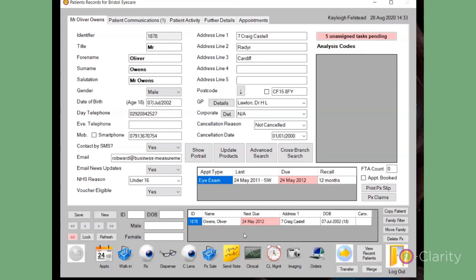If you are using the pre-screening, you should complete the pre-screen form before the full eye examination. Otherwise, there is a possibility that data entered into the full record will be overwritten by information from pre-screening.